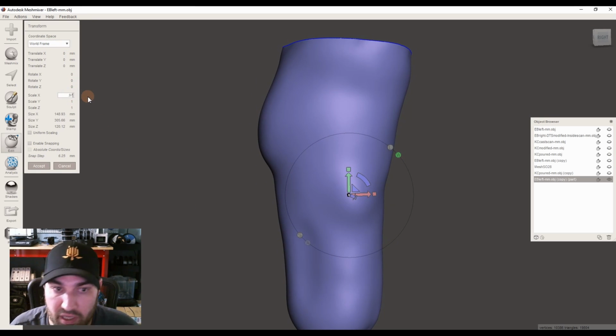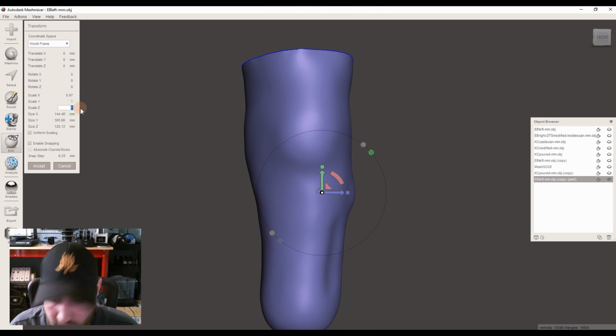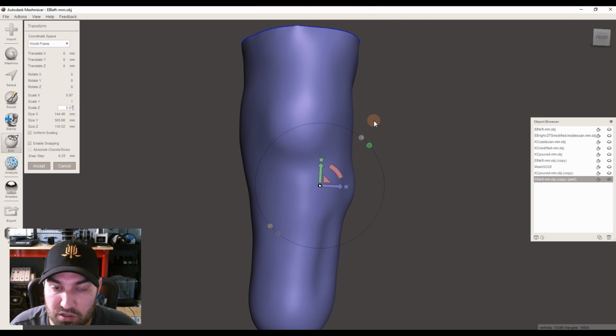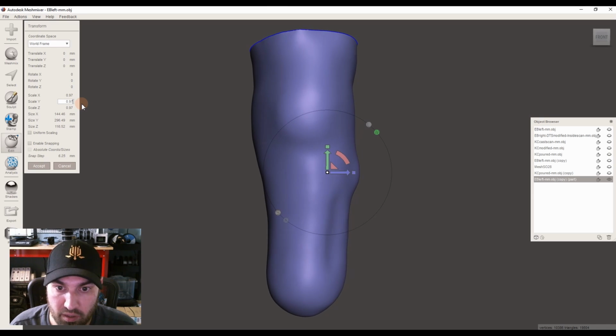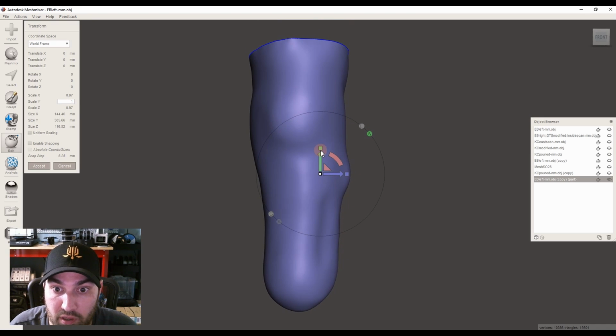So if you wanted to do like a 3% reduction on this model, you could do it in those two planes. So you've scaled it down left, right, front, back. We haven't touched the length. If we wanted to, you could do a length reduction there. You could also do that by a length reduction by size.